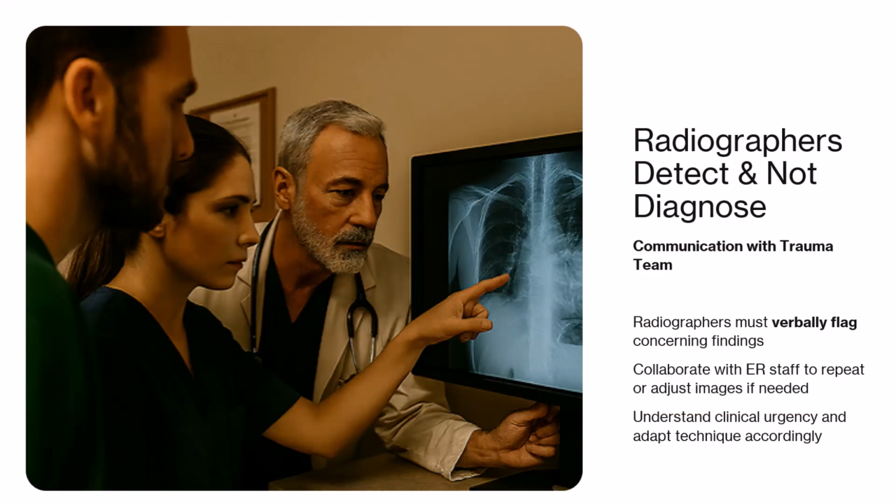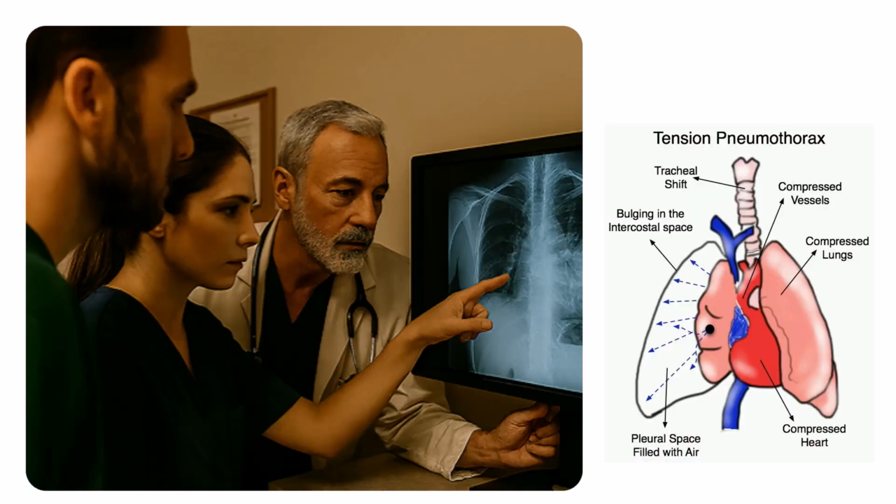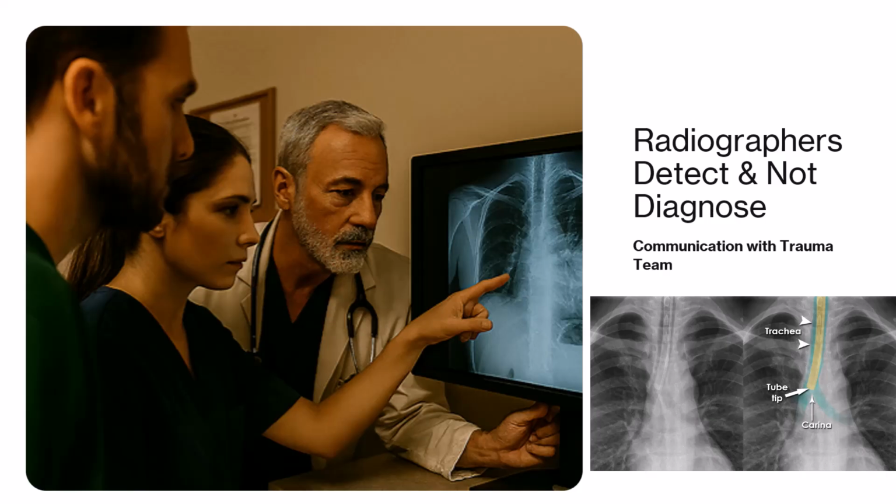In trauma imaging, especially chest radiography, radiographers are often the first eyes on the image, and their ability to flag the red flags clearly and respectfully is essential. Here's how we do it. Radiographers should be trained to recognize tension pneumothorax, which is a mediastinal shift or collapsed lung. Misplaced lines and tubes. For example, if the ET tube is too high or in the esophagus, a chest tube could go down into the fissure and collapse the lung.